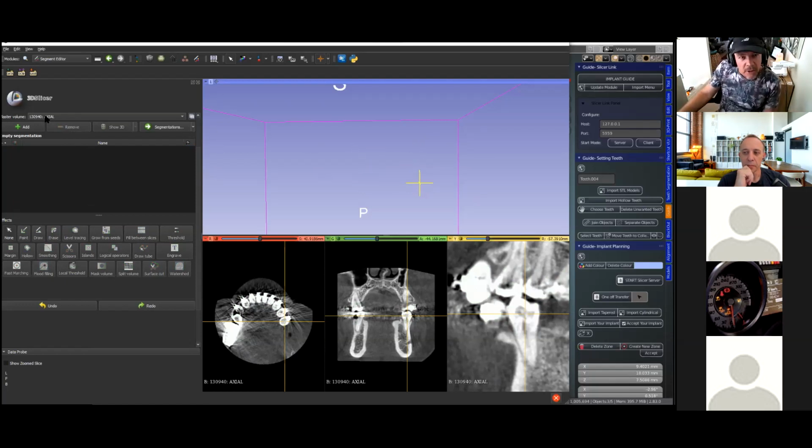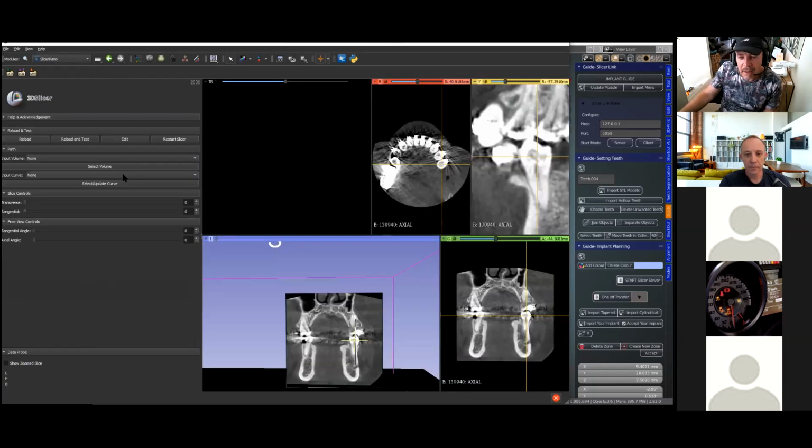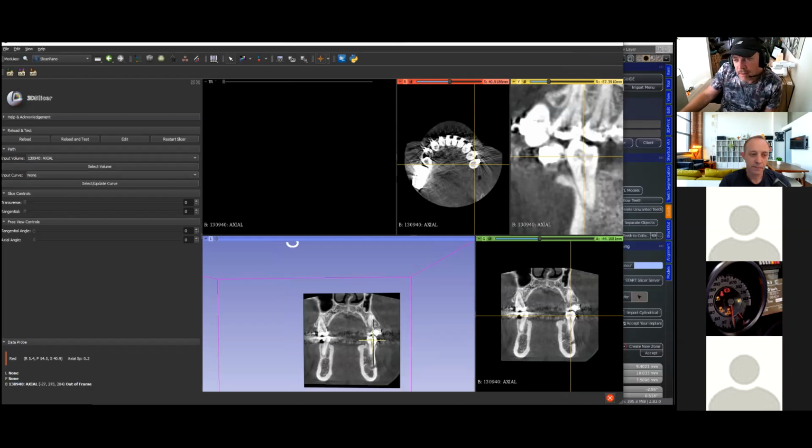All right, so we're going to go and use the second add-on, which is the Slicer Pano. And this puts the slices a little bit differently in our scene. And we want to then select our specific one that we are working on. So I think it's this one. Okay, yeah, it's this one.